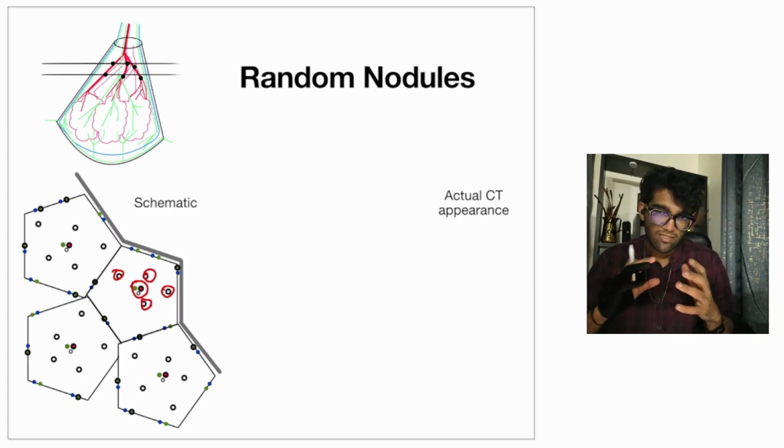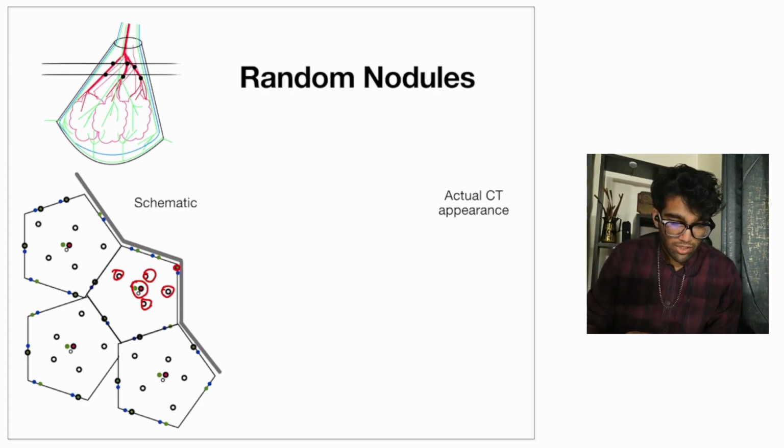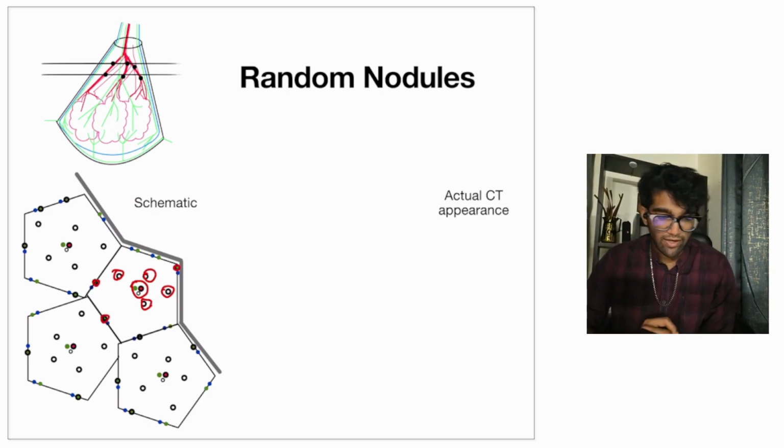They are in loosely packed clusters. Obviously they are not going to affect the venous side, because they'll get stuck in the arterial side. They could, however, secondarily be removed by lymphatics, so you could get some nodules arising along the lymphatic drainage.